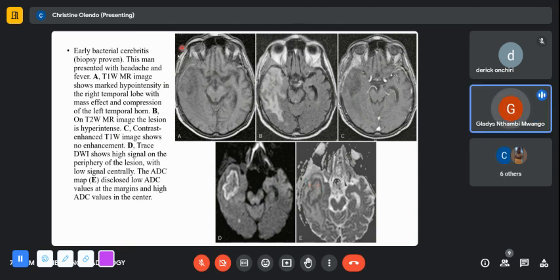What did you say image B is? B, T2. Although I saw this one, I wasn't sure it was T2. They labeled it as T2, but unless it's a FLAIR. Yeah, so it's T2, because the white matter looks gray. And the signal in the aqueduct is not really nulling. Yes, in the aqueduct. Okay.